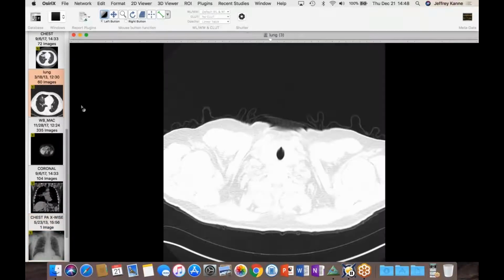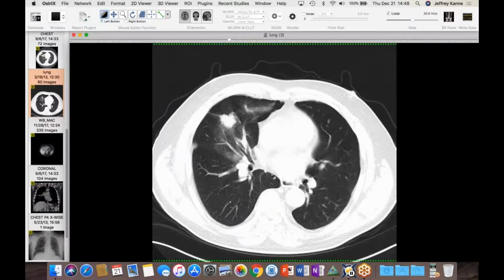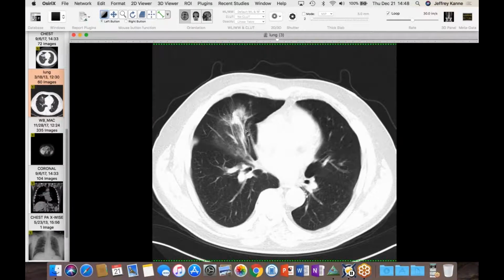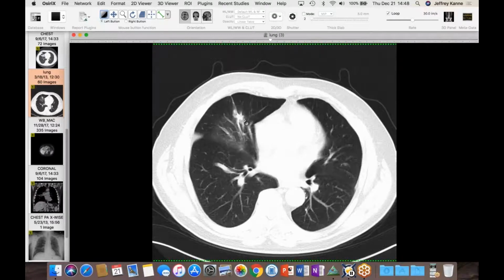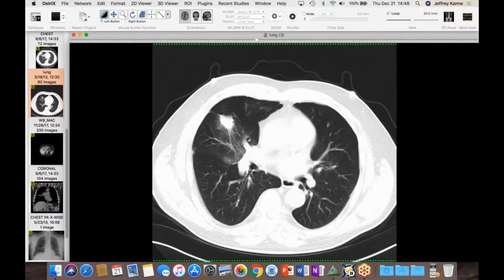And here is the CT from that time. And you can see there, and unfortunately these are thicker cuts, done elsewhere, but there's a nodule mass. There's surrounding ground glass, it's in the middle lobe there and crossing some kind of fissure, spiculated, and looks pretty ugly.